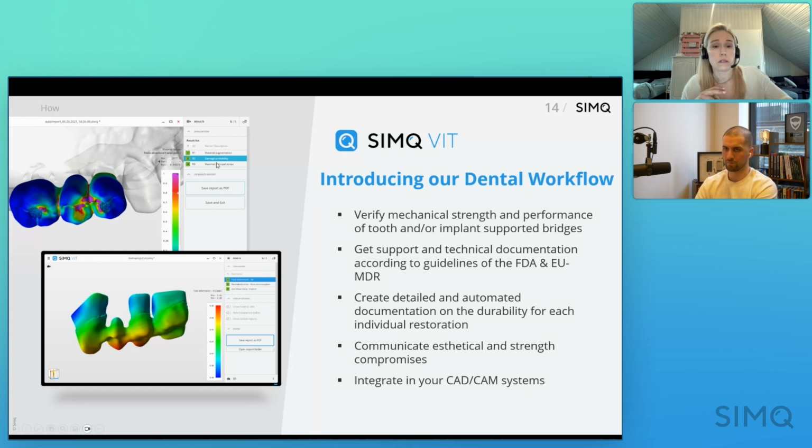You can see here, there's a couple of different results, which we'll get into in a little bit. But again, you verify the mechanical strength and performance of medical devices and implants, and tooth or implant supported bridges. Like I said, we also follow MDR. A lot of times FDA is mentioned because they're putting out the guidelines, but we also adhere to the MDR requirements as well.